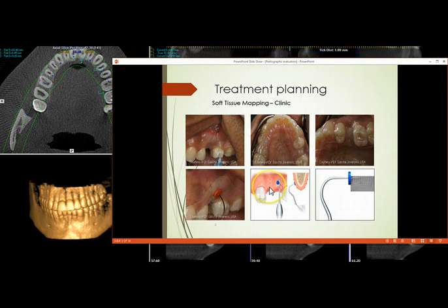So from this area, if the cross section, for example, from here to here, I measured 9 millimeters. I'm just hypothetically making a number up, 9 millimeters, and I'll place these dots in. I'll put one dot in, let's say right here. You can see on the stent. I'll subtract, and you place that dot in, and then you measure it. Let's say it's about 4 millimeters. So out of that 9, we'll subtract 4, and the other dot is going to be exactly on the other side on your stent. So you minus 4 here, you minus 4 here, or minus 2 here, and then your actual number is going to be a subtraction from the lingual to the buccal.